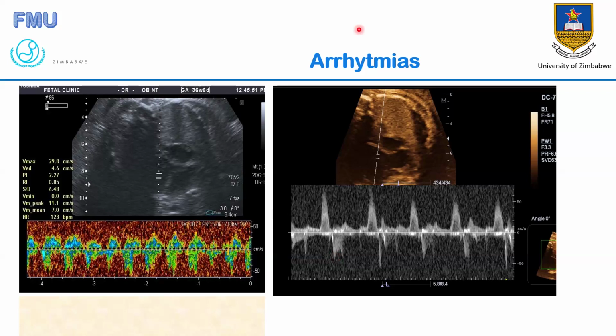There's only one person who is in this talk, that is Mukala Asmund. So the E and the A wave ratio is almost 1. So there's an abnormal E and the A wave. Very good. You can see that the E wave is almost overtaking the A wave. Usually there's a problem on this heart. Yeah. In other parts, you can see here it's almost overtaking, and also the gap between them. What else is wrong? Which is obvious, which I thought you guys would tell me first.